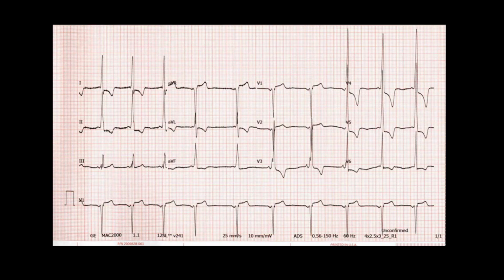So here's another example. Again, big giant QRS complexes. I see some ST elevation in V1, V2. Nothing crazy, but what I see that's really concerning if I'm scanning this for ischemia is I see some pretty significant ST depression, V4, V5, V6, and then extending out into 1 and maybe even a little bit in AVL. And so that would catch my eye, right? I would maybe think, oh, this is ischemic change, this is an ischemic pattern.